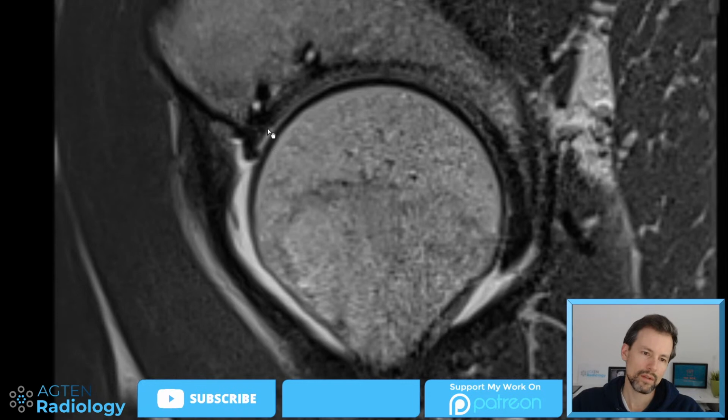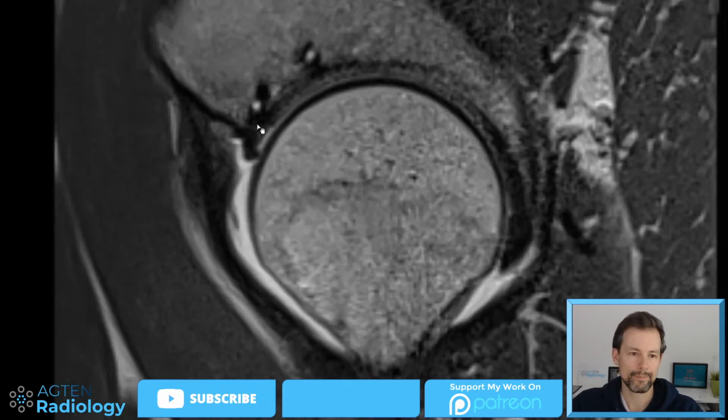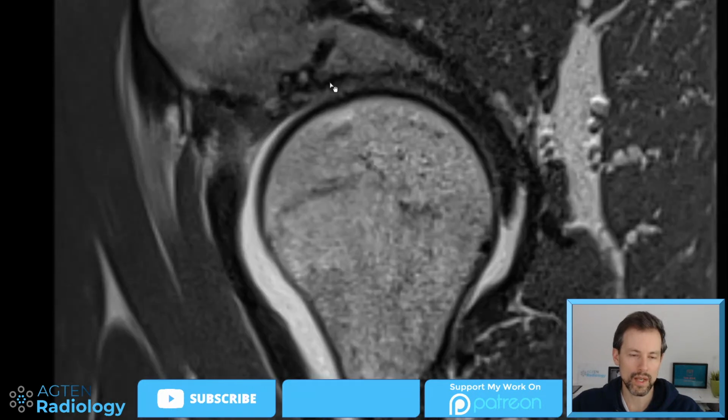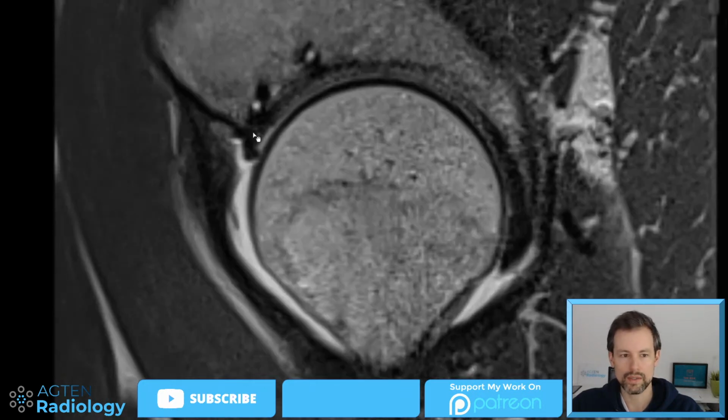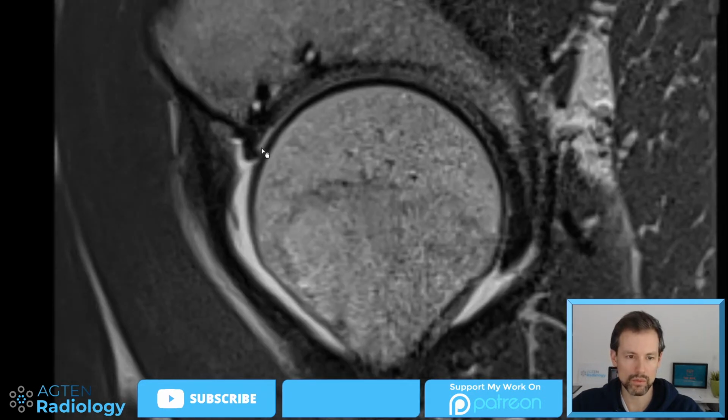So there is probably something going on here where the patient had prior damage at a very typical location, and this is where we would expect this kind of acetabular cartilage changes or erosions. Superior region of the acetabulum, obviously at the area where they had to fix or correct the labrum, right? So this is where the stuff happens anyway, so it's probably best to just have a look there.